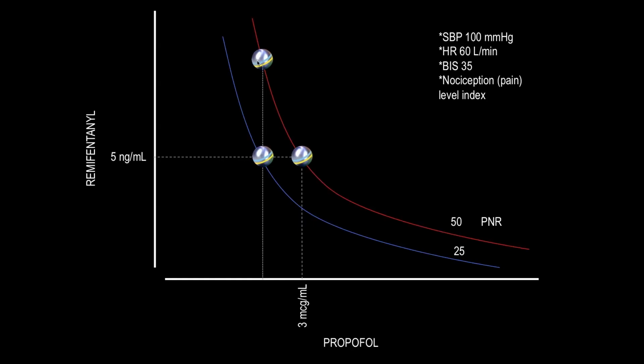So far, the available software has a representation of the synergic interaction curves in 2D, and they overlook the construction of the 3D surface model, where there is a clearer representation of space and time. Incorporate the PNR as an objective variable, having the possibility of selecting a desired point in the surface model, and based on this point, calculate the concentrations and infusions needed to reach this goal in a certain time. It is a challenge and a need in daily practice.